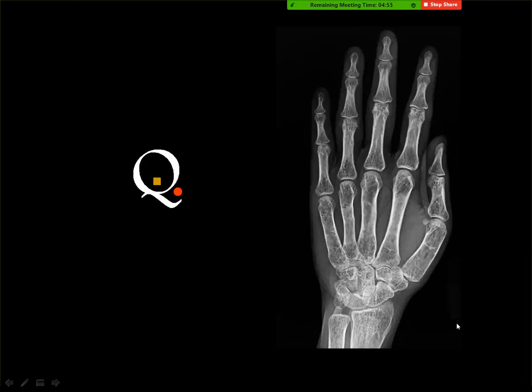And this is the hand of a patient with sarcoidosis? No, osteopenia? No. This is hemolytic anemia, and you remember in the lecture of hematological bone diseases, thalassemia and hemolytic anemia, and any form of hemolytic anemia will present itself in the skeleton by marrow hyperplasia. And the marrow hyperplasia means expansion of the bone and increase in the trabecular pattern. This hand is classic for thalassemia or any type of hemolytic anemia.